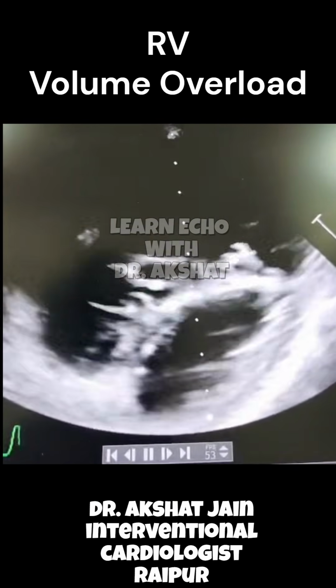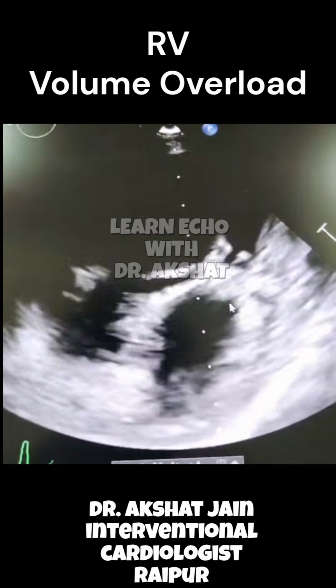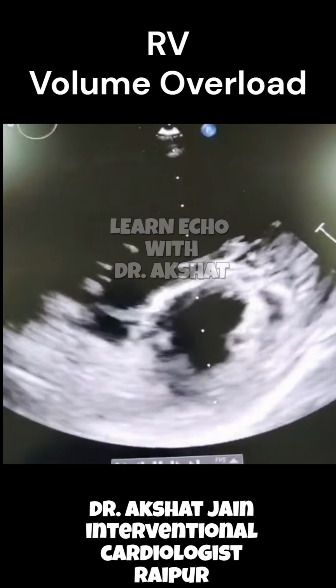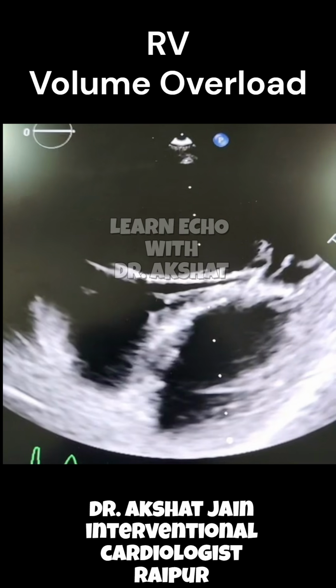So now compare this video with the previous video. If you see, the RV is also dilated here, but the D shape or the oval shape of the LV is happening not during systole but diastole. I will just play it frame by frame now.